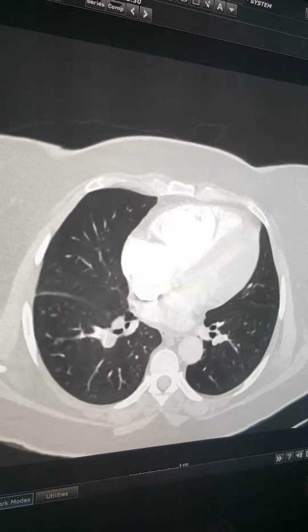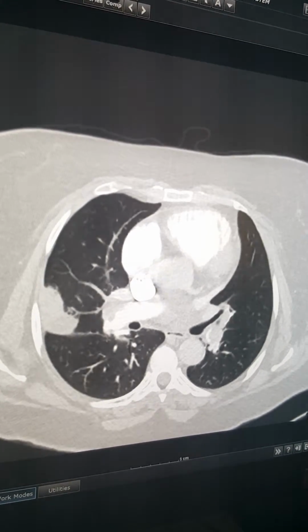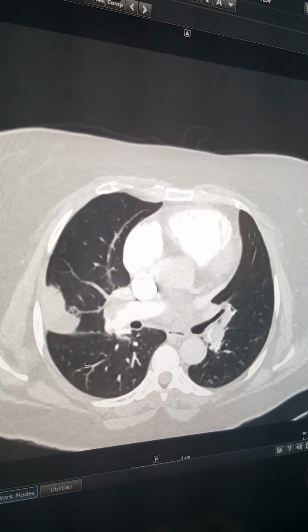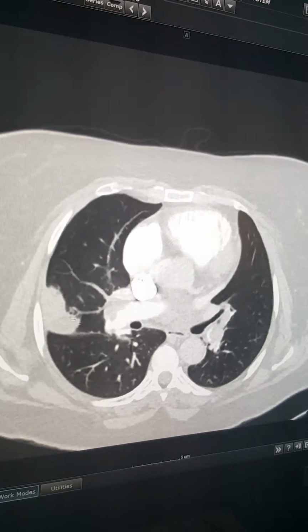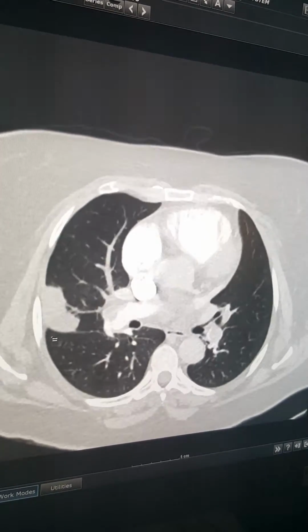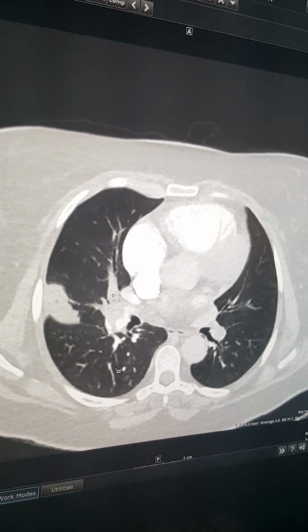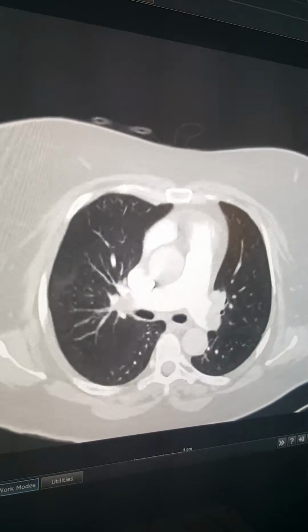So is this the way to differentiate it from consolidation? Absolutely, yeah. The problem in radiology is the controversy and overlap between infection and infarction, but the presence of a filling defect and wedge-shaped peripheral consolidation with central areas of lucency represents more of an infarct. So this is how we differentiate, I think.